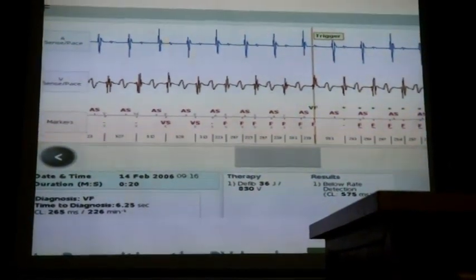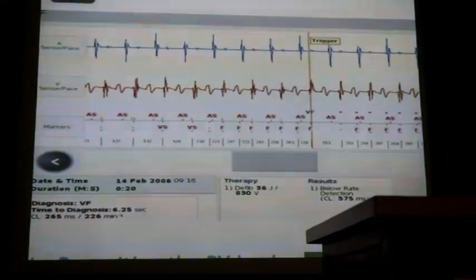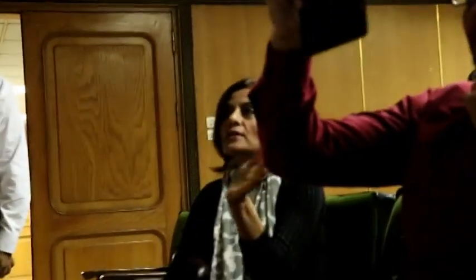We don't want to see this. Change to the filters. With our filters, yes. Our filters have made this disappear. Because a few years ago, the problem of T wave oversensing when you have a very small R wave is a very big problem, huge problem. And even when you increase the decay delay, it's still there.